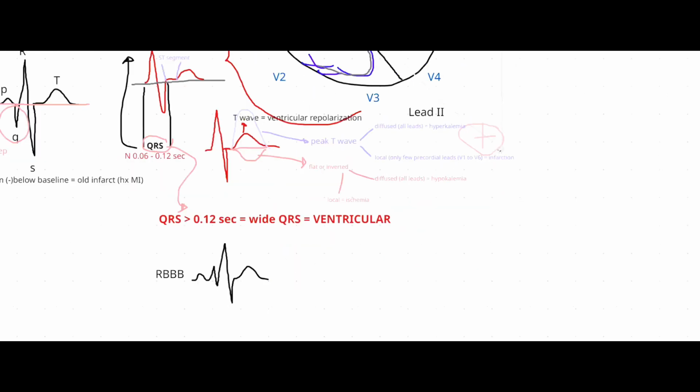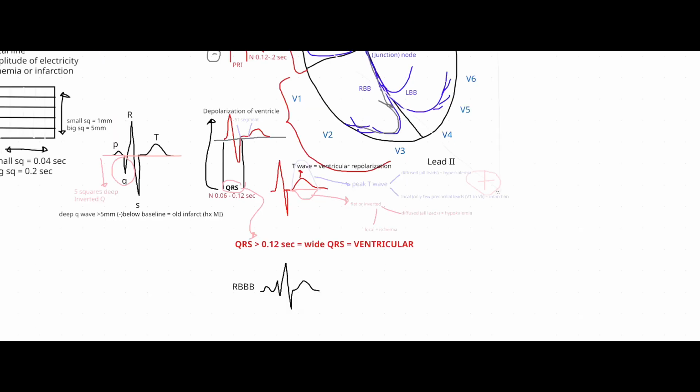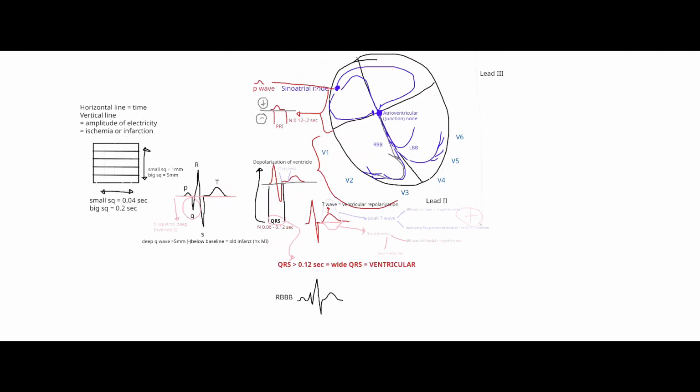Unless it's causing some kind of perfusion issue, such as a tachycardia, syncope, chest pain, tachypnea, stuff like that. What's more concerning is a left bundle branch block, okay? Because a left bundle branch block tells you that there's a problem in the conduction in the left ventricle, which is the part that is responsible for cardiac output, right? So that can turn into a more abnormal rhythm.